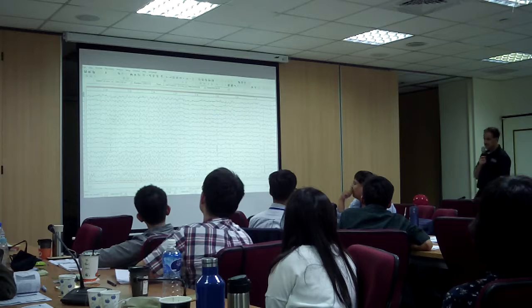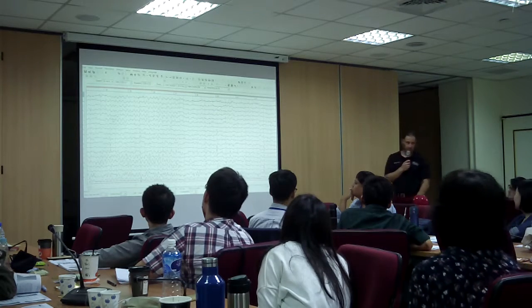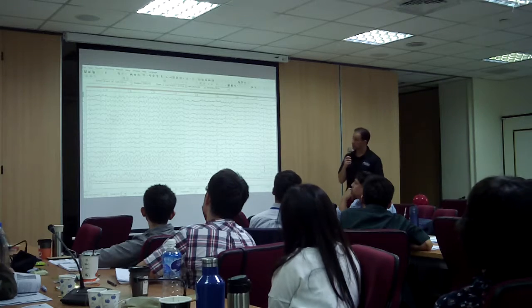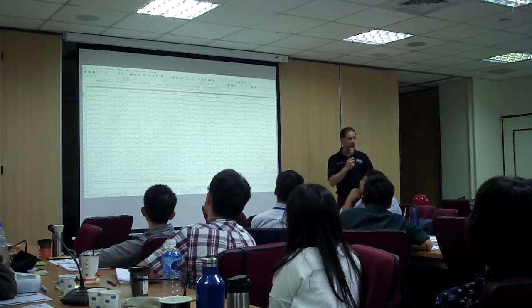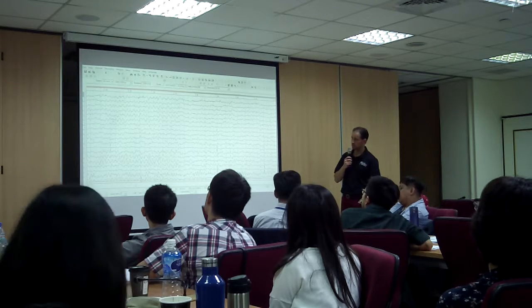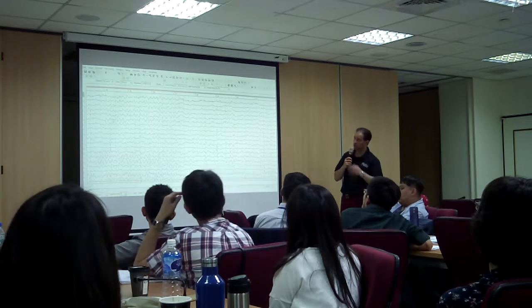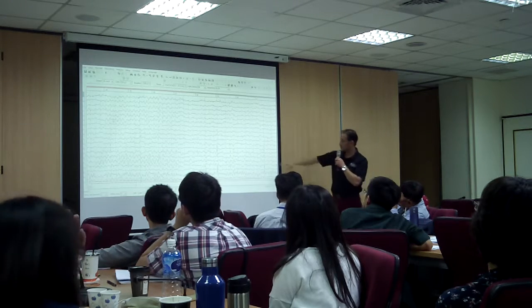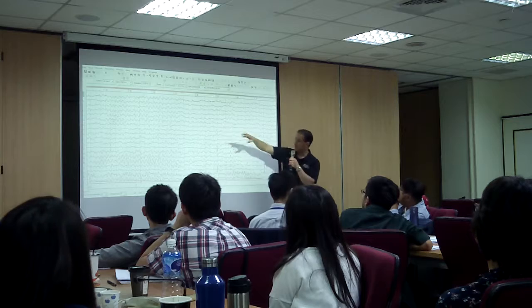The phase stability. And it increases what? So we got hypercoherence again. We had a hypercoherent brain too, with a lot of slowing. So we have some slow theta, 7 hertz. We got the epileptiform discharges, and we had hypercoherence.